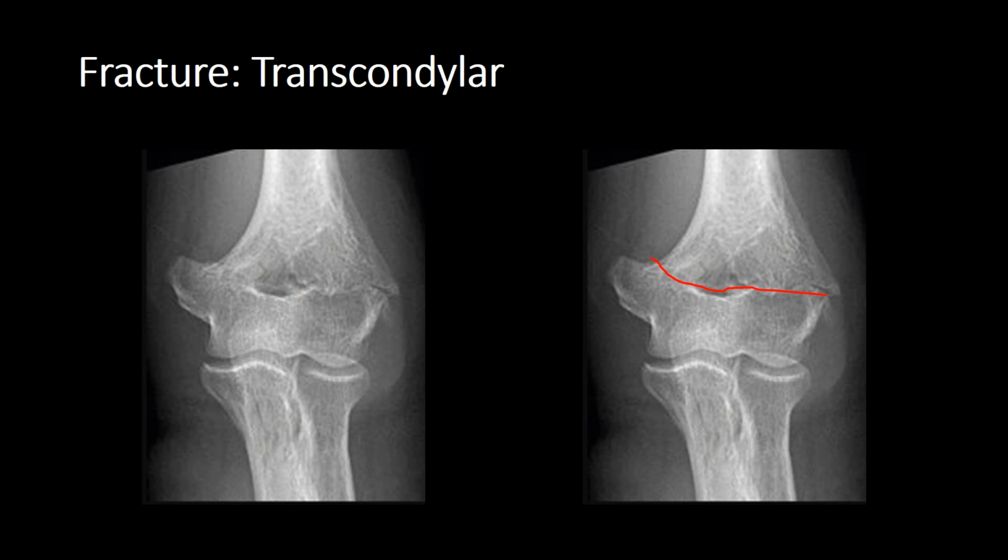Now the important thing to note is whether there's displacement or not. So let's have a look. Here is the distal portion of a proximal fragment laterally, and here is the distal portion of a proximal fragment medially, and medially here is the proximal portion of a distal fragment, and over on the lateral aspect here is the proximal portion of our distal fragment, and we can see that the two portions don't actually quite line up, and so therefore there is displacement here. There's only slight displacement, it won't take very much to align it, but it's something that you will need to comment on.